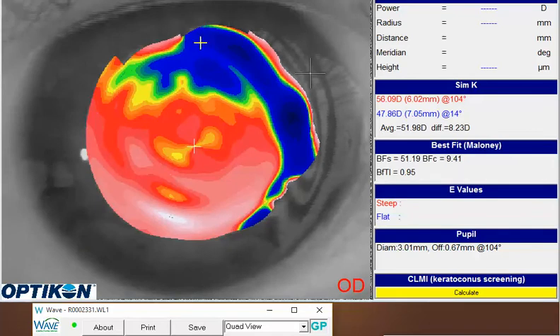as you know, we don't have a whole lot of true data out here in the peripheral cornea, so Wave is really designing a lens based on absent data, and that's not a fault of yours. During the topography, it's just one of the problems we run into sometimes with these steep corneas. Wave has a hard time, or Scout has a hard time capturing this peripheral data.